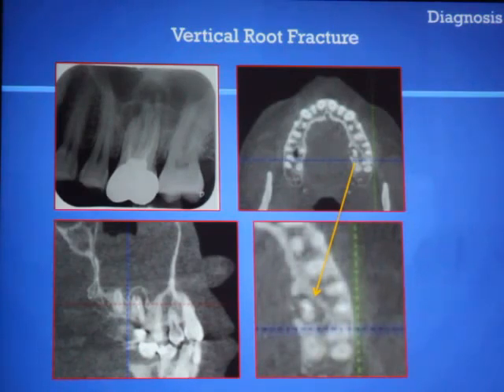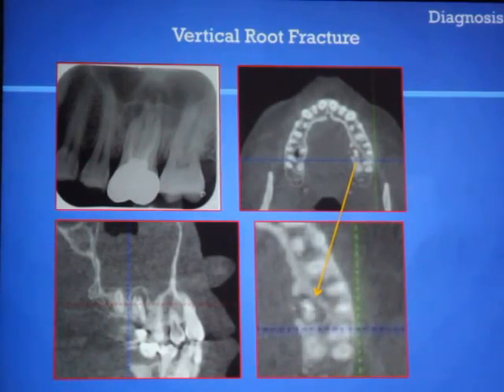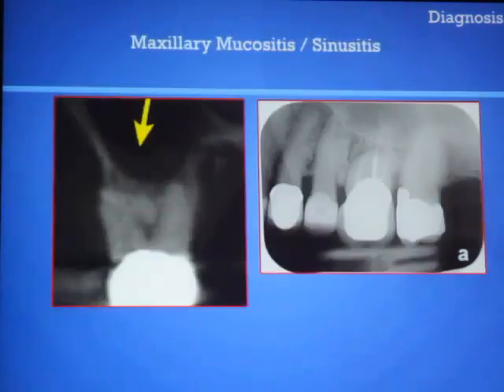Và đây là một hình ảnh khác nữa của hiện tượng nứt vỡ chân răng vòm miệng của răng hàm lớn nhất đằng trên. Thì các anh chị có thể nhìn thấy rằng trên cái lát cắt của phim chụp thì thấy có một tổn thương rất là lớn xung quanh chân vòm miệng này. This type of isolated defects are very typical of a vertical root fracture. Đây là những tổn thương vô cùng điển hình của hiện tượng nứt vỡ chân răng.